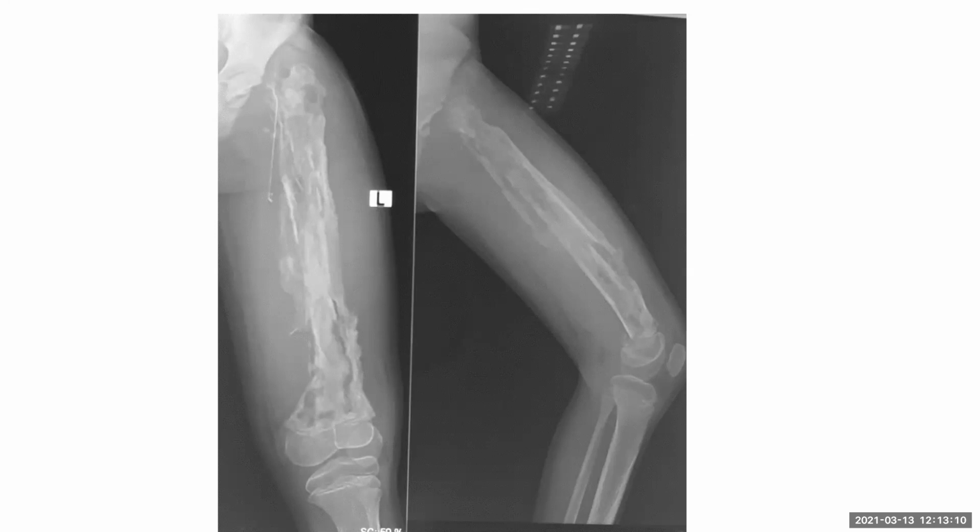I'm thinking of two possibilities. I would consider post-traumatic myositis ossificans if the patient is asymptomatic. However, if there is a history of recurrent sepsis, fever in this patient, and with this morphology, I would also consider chronic osteomyelitis with involucrum and sequestrum formation and cloacae formation, repeated episodes as the other possibility. I would compare with the previous, and considering the inflammatory markers and the clinical suspicion, I would communicate with the clinician and refer to the pediatrics.